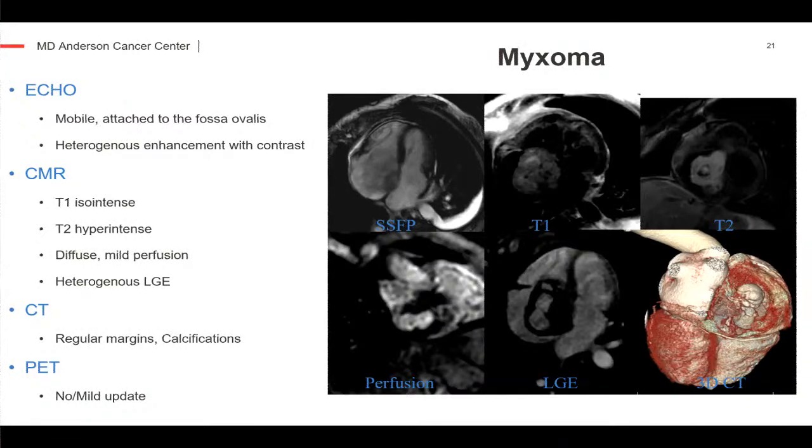This patient was referred to surgery, and she got a CCTA. And if you look at the posterior aspect of the RA, where there are extensive vascular networks, the surgeons were really hesitant at the time of taking her to the OR. They were thinking it may be an angiosarcoma. Thankfully, tissue diagnosis came back as just a very hypervascular myxoma. On CT, they tend to have calcifications. When you see them on PET, they are usually not FDG avid or just have minimal avidity.